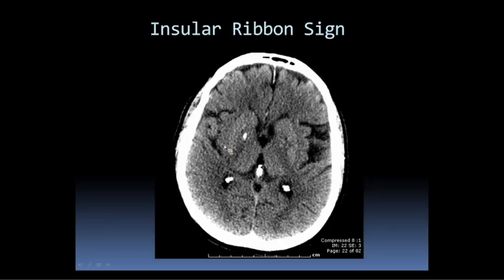So we look at the cortical ribbon all around the brain. The insula is generally seen nicely on an axial image because you're cutting it perpendicular to its trajectory. So you should see a little bright signal along the cortical ribbon. Underlying it is a dark density, and then underlying that is more bright density, so it has a layered, lamellated appearance. The brighter density here is the basal ganglia, the putamen specifically. This is the subinsular white matter. This is the insular cortex.